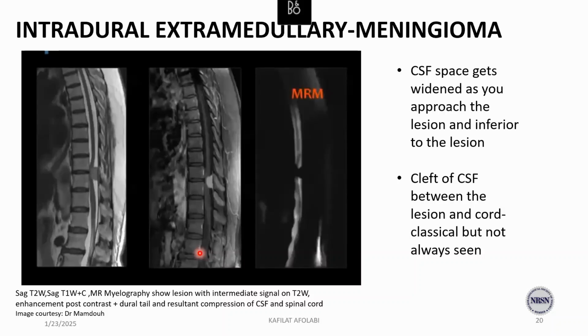However, in real life practice, please do not characterize lesions on sagittal views alone. It is good practice to look at the axial section and correlate it with what we are seeing on the sagittal view, especially to discriminate properly the location of the tumor, which will then decide the differential or ultimately the diagnosis you're going to give to lesions.